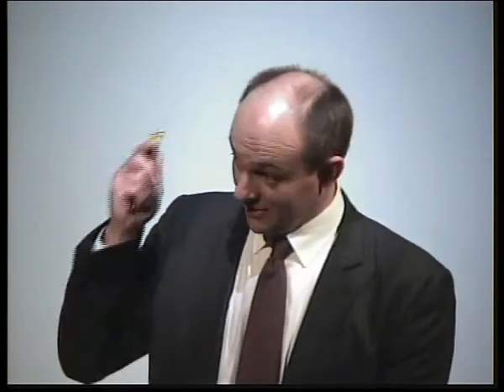Clearly hip arthroscopy is a hassle. There's all this stuff in the way. It's a small, deeply located joint, and you need lots of kit. I cannot underestimate the importance of teamwork doing hip arthroscopy. Everyone needs to basically know what they're doing so you can concentrate on the surgery. Because if you have to sort the staff out, tell the nurses where every single little bit has to go and explain everything, it's absolutely exhausting.